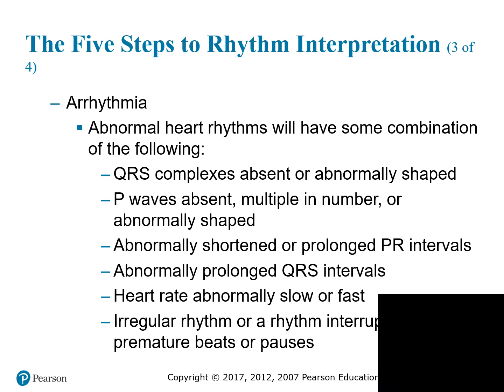You might have PPQRS, or you might have PPPQRS, or you might have QRS, T, and then a P right after the T, and then you'll have another P. So that means your P's are abnormally shaped. They can be absent, or they can be multiple numbers, or different in different areas of the rhythm strip, because normally it's supposed to precede the QRS, be before the QRS.